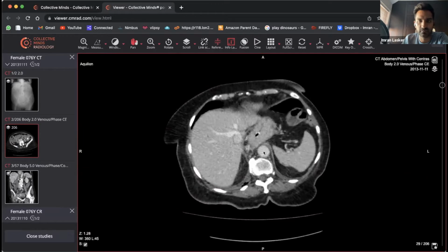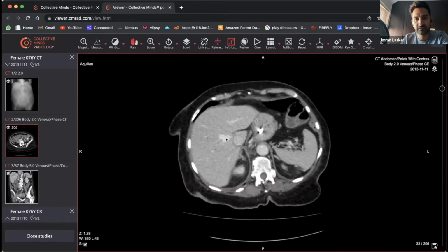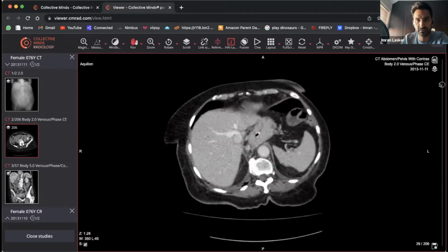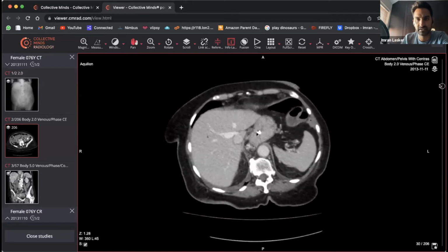So first of all, what phase of imaging are we looking at? That's the aorta. It doesn't look as bright as the spine there. Fine, fair enough. Coming forwards, we can see that the portal vein sitting over here looks brighter than the aorta, so therefore it's more likely to be a portovenous image. There's a hyperdensity sitting over here, which is most likely to be an NG tube.